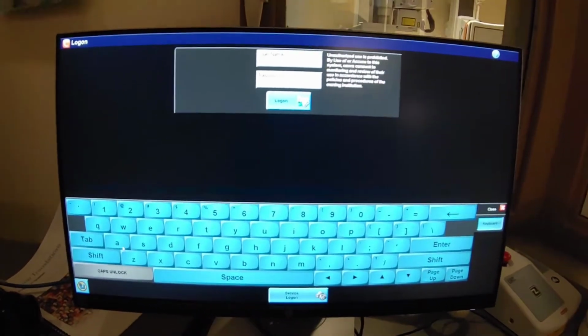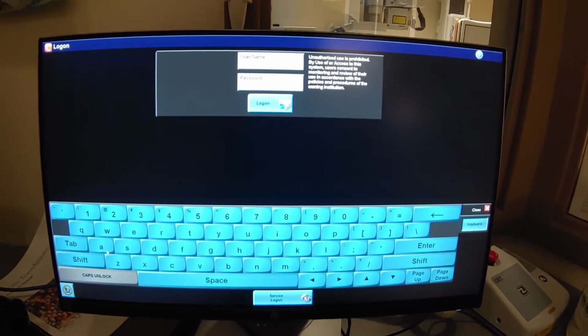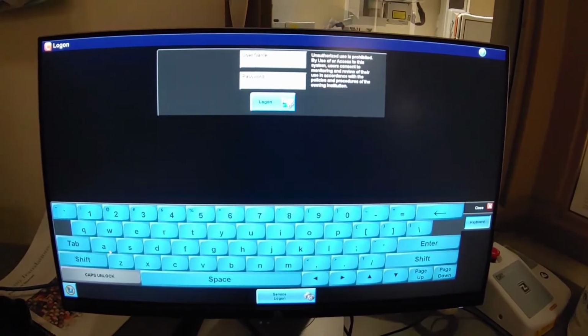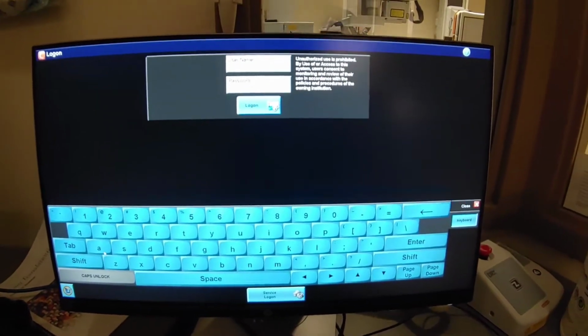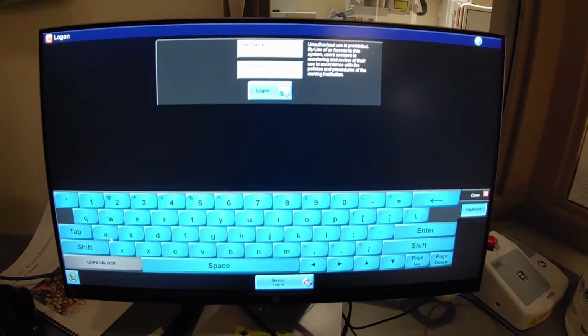Alright guys, so this one is for all the new people coming in who need to create a user ID, I guess, on the Carestream equipment, okay? So when you come into any workstation or portable device, this is your main screen, your login screen.